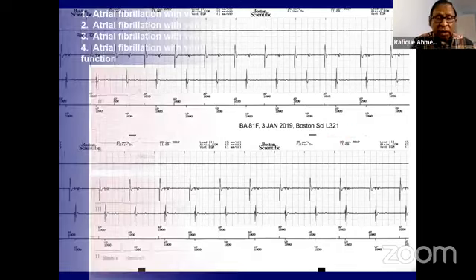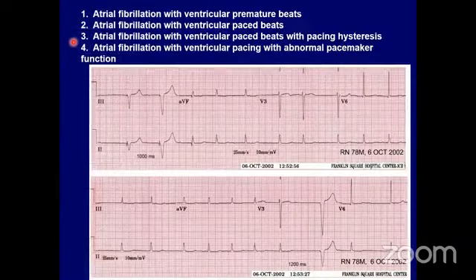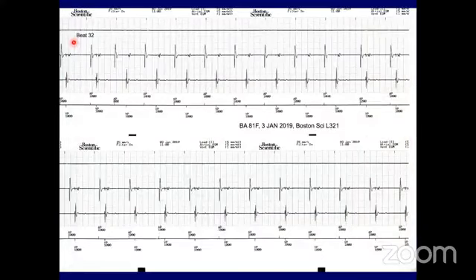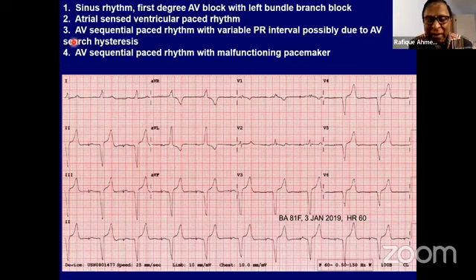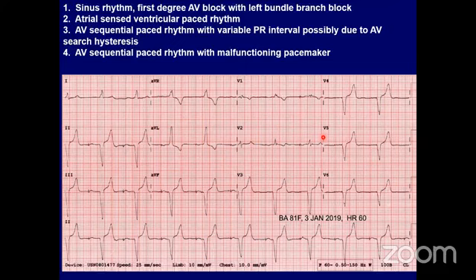Thank you. Sir, there's a question. Why is there an RBBB pattern in the ECG in V1? Can it confuse things? Yes. I wonder if there is a degree of fusion. I don't have the baseline ECG on this patient. It is because the QRS is relatively narrow. The other possibility is whether it's a biventricular pacemaker, but I don't think this was a biventricular pacemaker. It was a regular pacemaker. The interrogation shows that it is a dual chamber pacemaker, but still V1 shows the RBBB morphology. Yes, you're right. Absolutely.